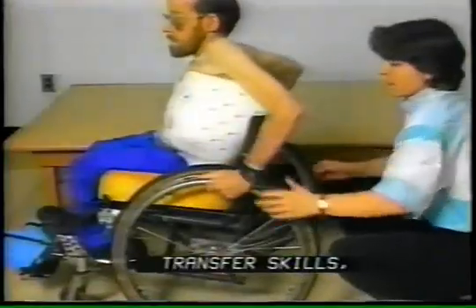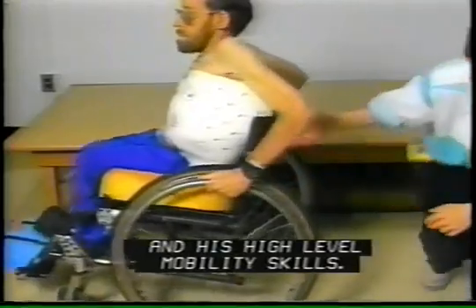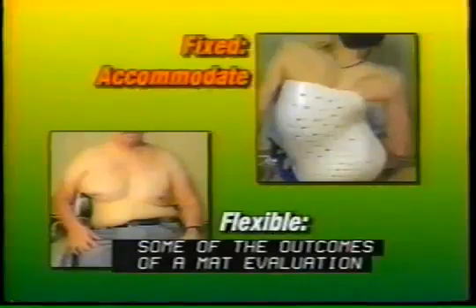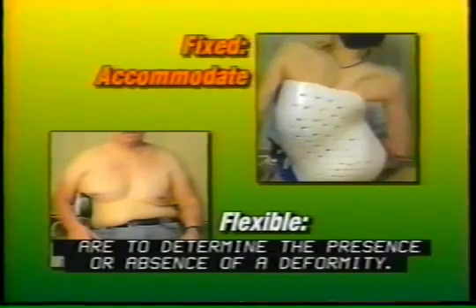For Chris, the accommodative solution could not interfere with his independent living arrangements, transfer skills, and his high-level mobility skills. Mounting the support to Chris's body rather than to his chair allowed him to maintain his active lifestyle despite a painful, fixed spinal deformity.